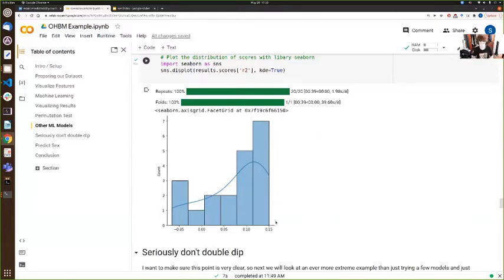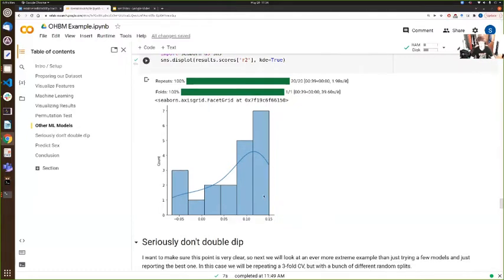The point is basically, one, you probably want more subjects than we're using in this example. And two, because it's so easy to work your results like this with cross-validation, you need to be really careful with the steps that you do.